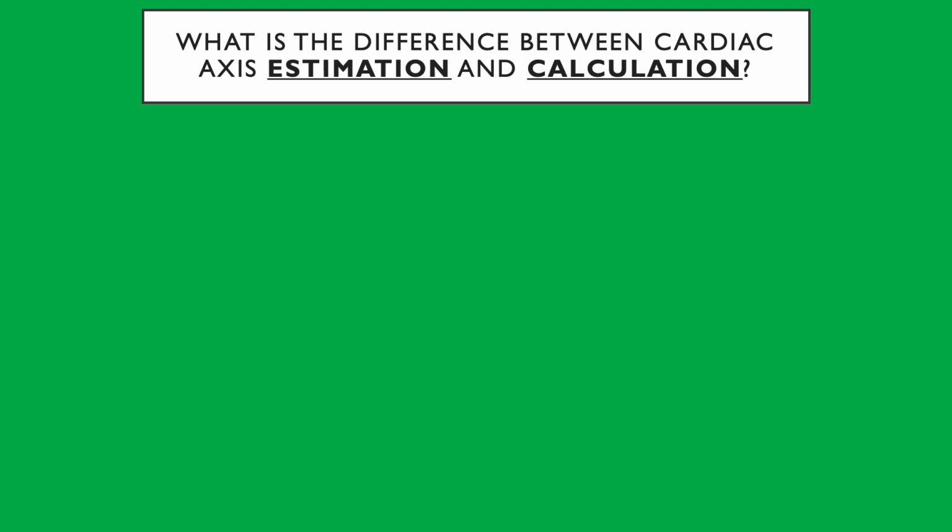What do you mean it's only on lead 1? No, the degree on the estimate. I think the estimation is deflection, you look at the positivity and negativity of the leads, for example the QRS. Okay, everyone back here.